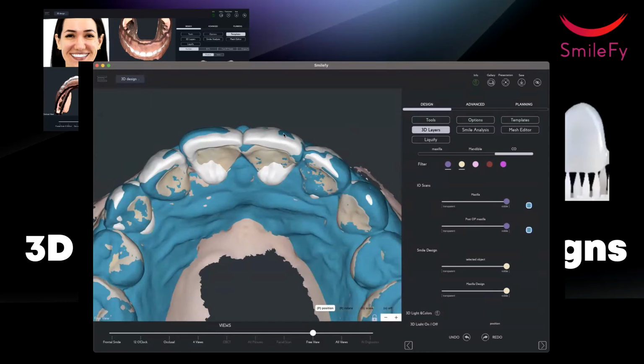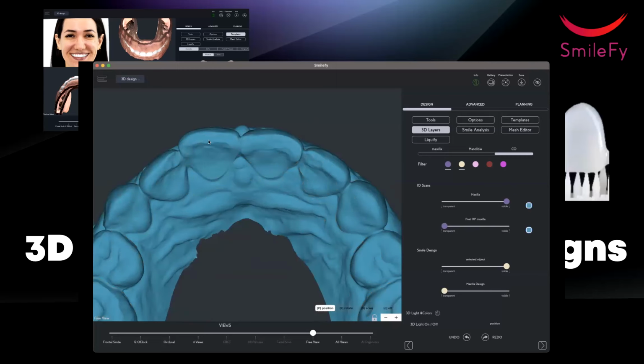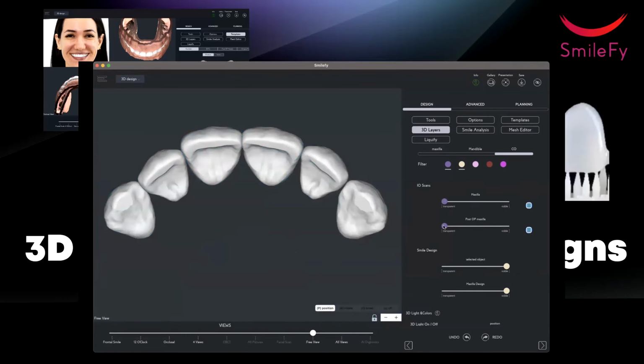But here we can check and see, okay, we are very close to the original teeth of the patient. This one was wrong from the very beginning because that central was in the wrong position, right? So for that central could be an ortho correction or a more aggressive prep to make space for the veneer, right? But we didn't lose lip support. You see the canine, here the canine, the laterals, the left central, we have the lip support preserved.